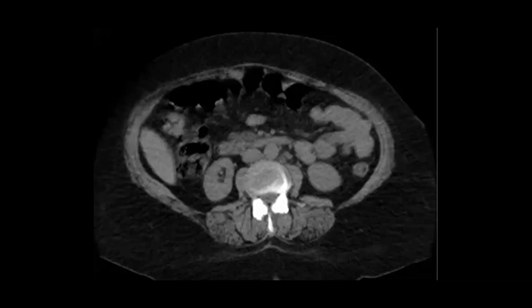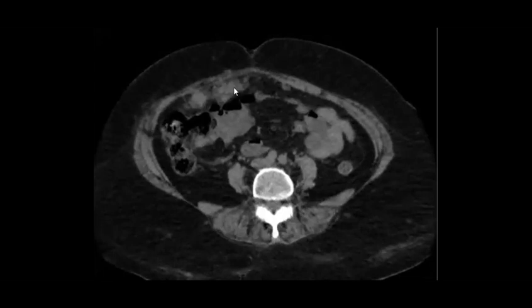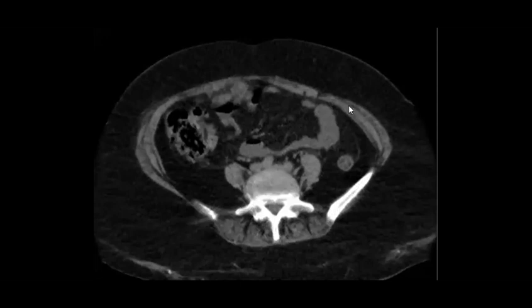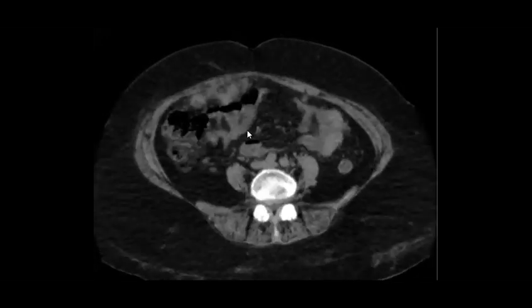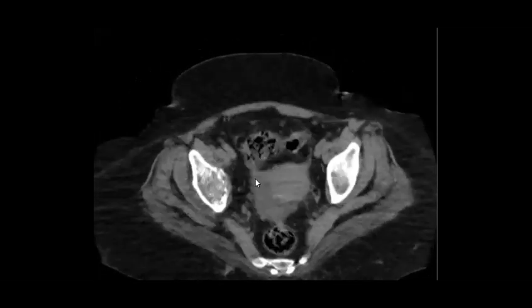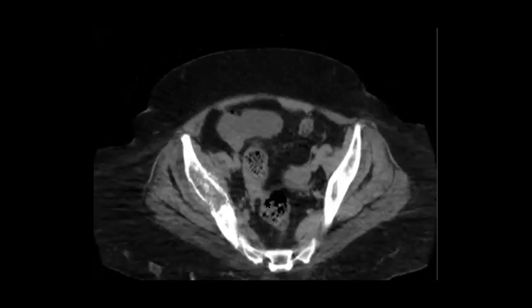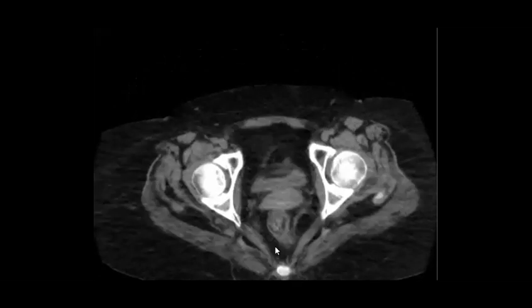If anyone wants to list. But I just want to show you the most important thing: not to miss the peritoneal nodules in this case, which are sometimes very subtle. So look carefully in the fat. And unfortunately, this case was non-contrast. And also the ovary can be just a cyst or it can be something more. So that's what you need to check, that you need more and more.